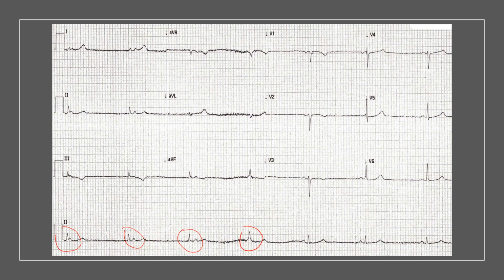Then let's look at the P waves. The P waves in lead AVR are pointing down, so negative. In lead 2 they are pointing up, so positive. So first of all, the impulses that are producing these P waves are coming from the SA node, because we've got here a normal sinus rhythm. This is a sinus rhythm because the P waves are inverted in AVR and upright in lead 2.